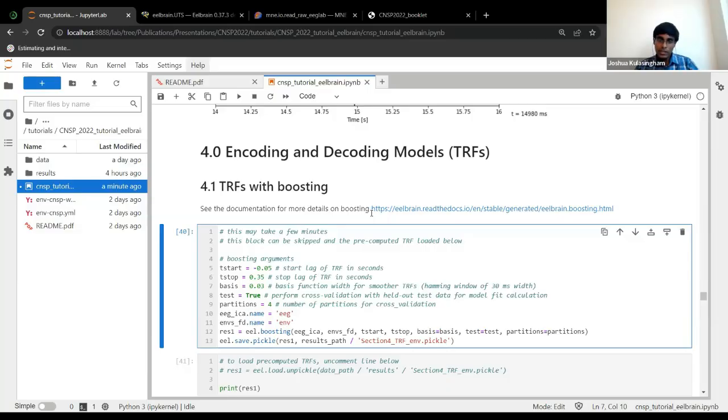Yeah, I think at the moment Eelbrain will give errors, because you would have a different type of split for each. It doesn't have a way to handle that missing data. But for your case, you can always just run the TRF independently at each channel, because that's what's happening under the hood. It doesn't care about other channels. So you can just run a TRF in a loop outside for each channel. Or you can interpolate bad channels, like someone just mentioned, of course.